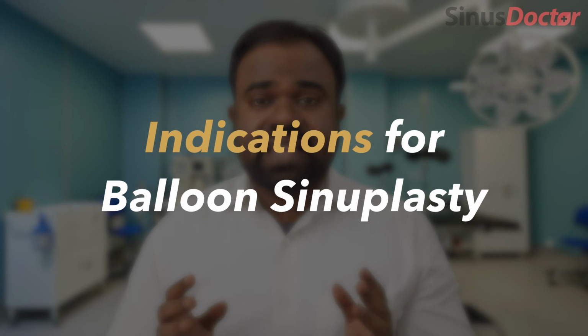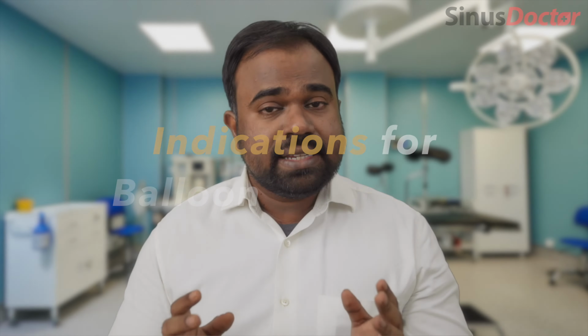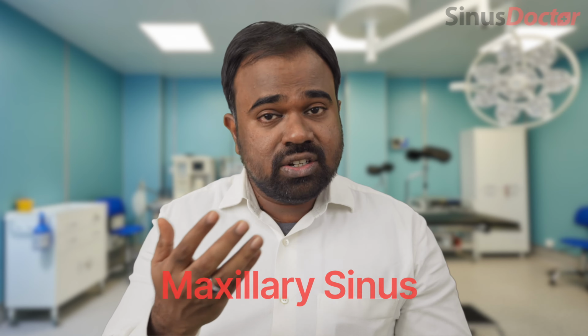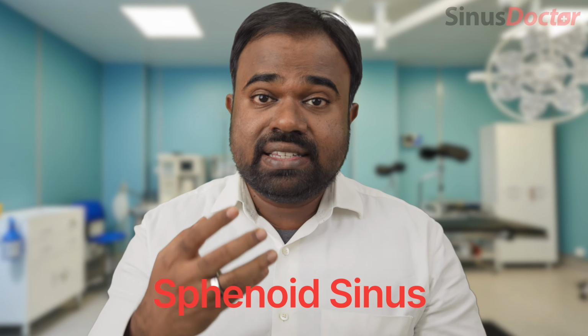In which sinus conditions can balloon sinuplasty be used? Balloon sinuplasty can be used in all types of chronic sinusitis patients. When the sinusitis involves the sinuses above the eyes, that is the frontal sinus, the sinuses below the eyes, that is the maxillary sinus, and the sinuses present in the back part of the nose, that is the sphenoid sinus, we can use balloon sinuplasty to open up these sinus drainage openings. Balloon sinuplasty, however, cannot be used for opening up the sinuses between the eyes, that is the ethmoid sinuses.